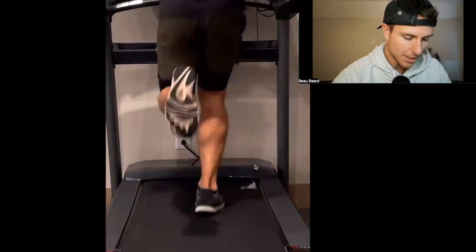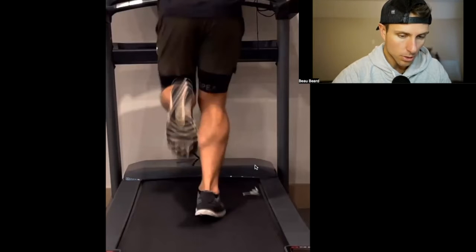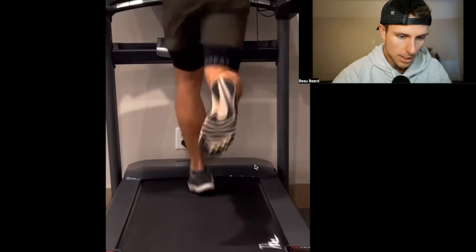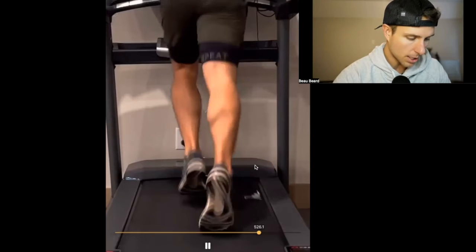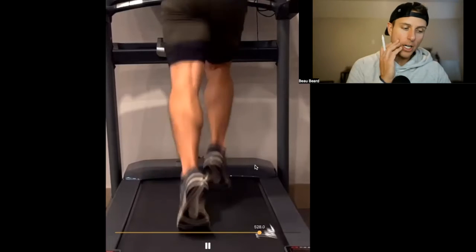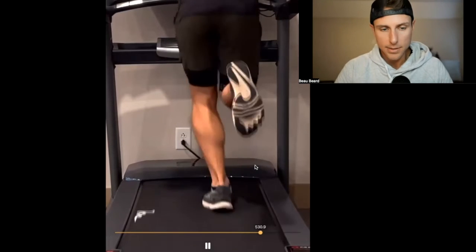I'd say, and you can tell how much of a forefoot runner I am. Here I am in an ultra, pretty neutral or low pro ultra. This is what was at the office that I just grabbed. Over here, same thing, good supinated position, angular velocity about the same. So we'll let that play just so we can kind of watch it. But again, I'm a very forefoot runner. I'm going to be predominated mainly with injuries below the knee is what the data would tell us.